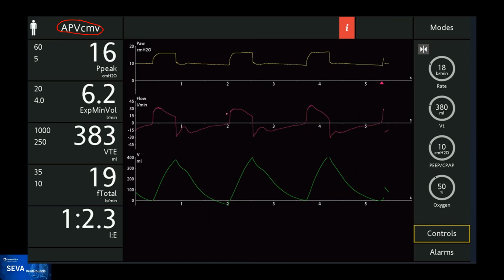Now we can see the inspiratory flow shapes are quite variable, which is a characteristic of any pressure control mode, where the flow waveform is free to assume any flow shape. And as Rob is pointing out, when the patient is passive, the flow from the initial peak inspiratory flow decays exponentially. So let's get into the tag before we run out of time here.